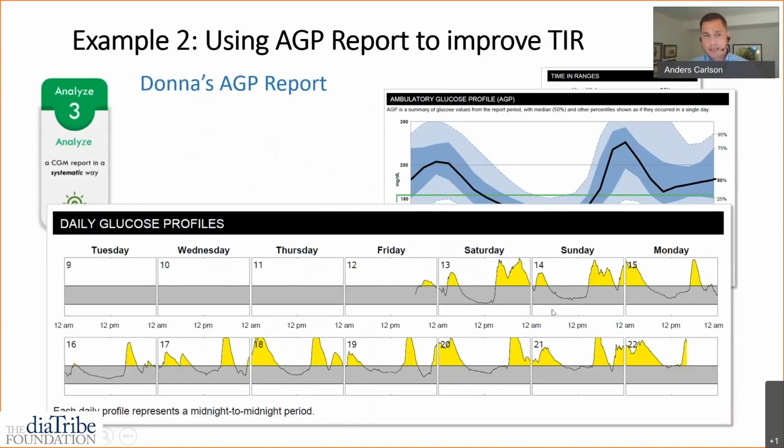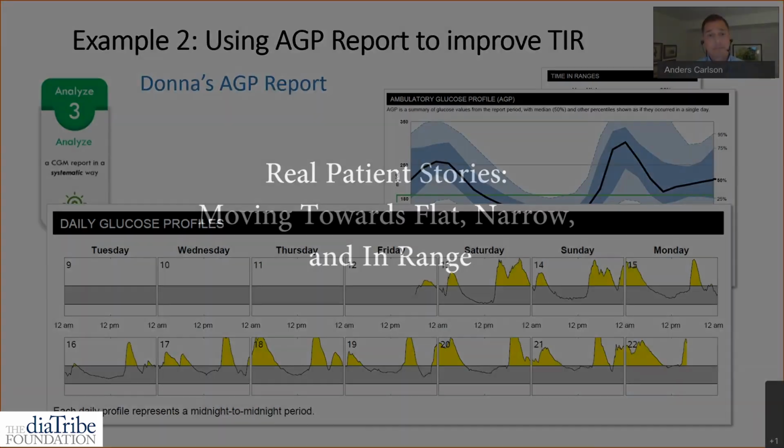Again, here you can see that at dinner there's a clear spike, and then many nights, not always, there's another separate spike from that evening snack. That evening snack, I should say, she does not cover with insulin. That's purely to keep the glucose higher overnight. And dinner is a bit of a moving target. Sometimes she gets busy and takes her dinner bolus right when she's eating, or takes her dinner dose 5 or 10 minutes after she's started to eat.